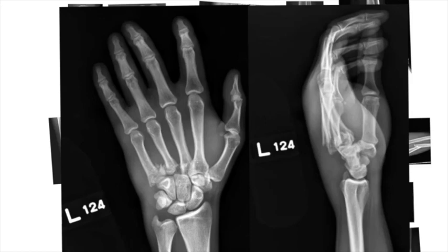and the feet. So you're still going to look for smooth and not smooth, right? So this is smooth, smooth, smooth, smooth, not smooth. Okay, so clearly there's fractures here, and you can see the metacarpals are all displaced posteriorly. There is malalignment with respect to the metacarpals and the wrist joint. When you follow the smoothness of the cortex, you'll see smooth, smooth, smooth, not smooth, right? Not smooth. So clearly you've identified some fractures.